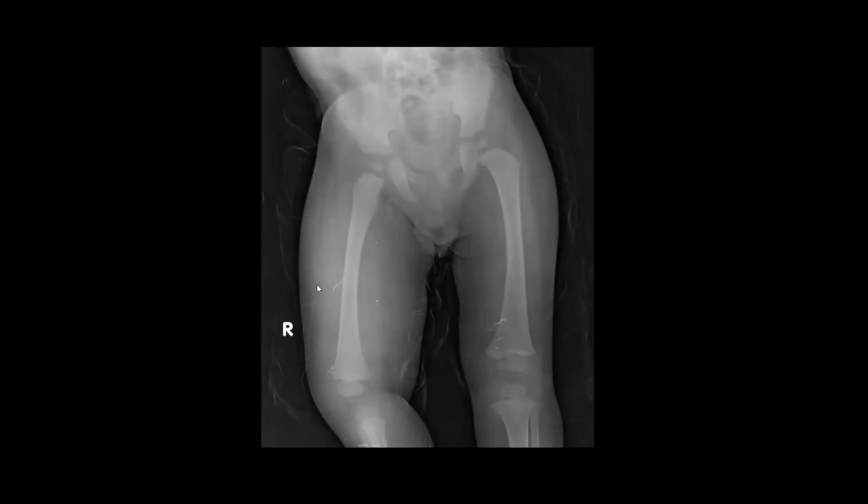So besides the bones, you have to look for the discrepancy in the soft tissue. You have to mention it. Try practicing the review areas in the chest x-ray. Pediatric x-rays can be very tricky. If you miss such a thing on a plain radiograph, they might fail you the whole of the case. Other than the bones, yes, you were thinking of the SUFE and other things. That was good. You were thinking of AVN. That was good. But the soft tissues should be in your mind.